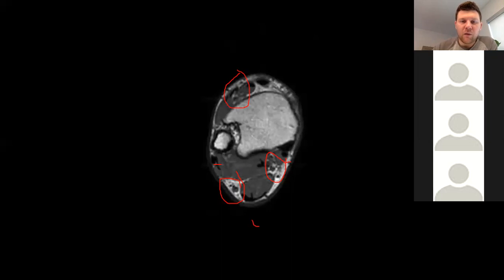So when you actually look at it and we see right here, which tendon was that one? EHL. Good. And which tendon was this one? Anterior tib. Okay. So if you're doing an anterior ankle surgery and you want to cut safely, whether we're doing maybe an ankle replacement or an ankle fusion, if you can identify the anterior tib tendon and the EHL tendon, you can safely make a cut in between those two. But if you're going more lateral, lateral to the EHL tendon, then you're going to get into your neurovascular bundle there. So it's not a safe zone.